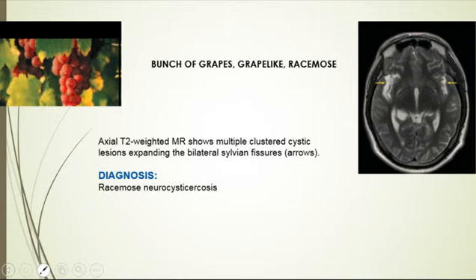After that, there will be granular nodular neurocysticercosis characterized by cyst retraction with gliosis. The calcified nodular neurocysticercosis is the non-active stage. The lesion has completely involuted and calcified. Okay, so it starts with nothing, a cyst with a dot, some edema, then enhancement and edema, and then they start to die and then calcify. Okay, this is the pattern. When you see edema and enhancement, it starts to die. Not the patient, the cyst.